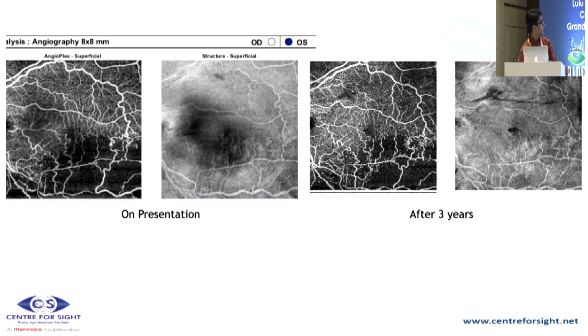And in 3 years, what we see, this was on presentation, the macular ischemia and the collateral vessels. After 3 years, these areas are still there, but what we see is this line-like structure. This is the formation of ERM which is taking place in this patient, and you see this dragging of the macula. Still, the patient is maintaining 6/12 vision, and she doesn't have any major visual complaints.